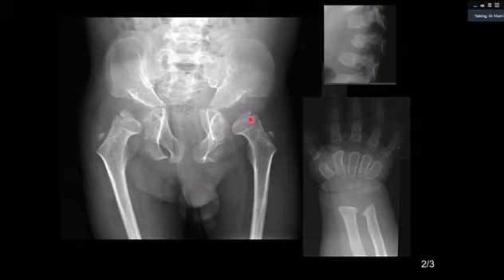If you see these femoral capital epiphyses, they look to be slightly stippled. At the pelvis, it is narrow. And this pelvis, by the way, in description is known as the simian type of pelvis, ape-like pelvis. So all of this together, what is the diagnosis?